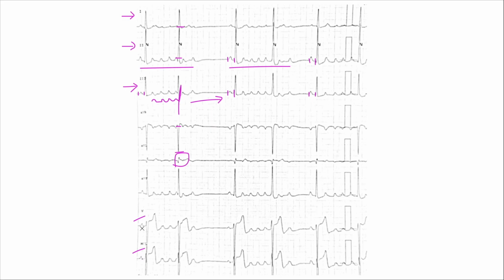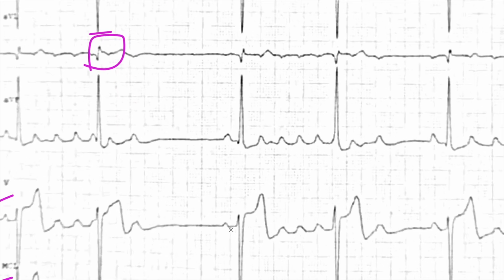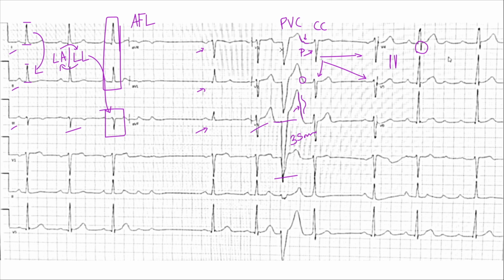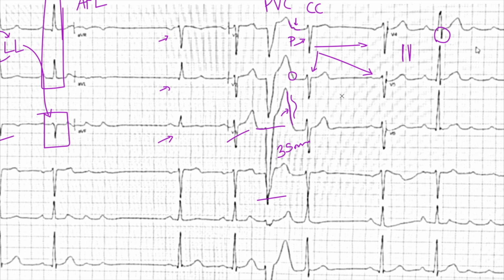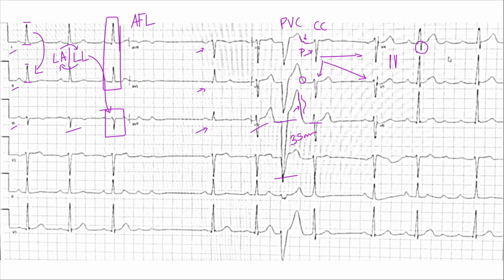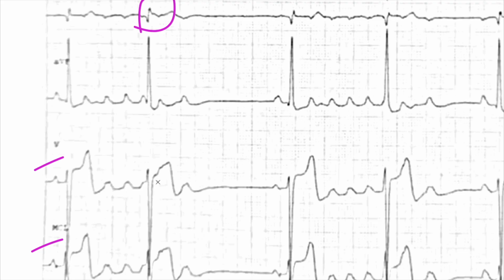And let's see, what else do we have here? Look at this now. Now these are modified chest leads. Let's go back to the 12 lead here. Here in the 12 lead, we're not getting any ST elevation. Not really. Maybe it's subtle. Okay, maybe there is something going on here, but it's very, very subtle, to the point where you can ignore it. Well, maybe not. We might have a little bit here in V3. See, I didn't catch that the first time. Right. Now, when you take a look at it here, maybe this is the cleanest example.